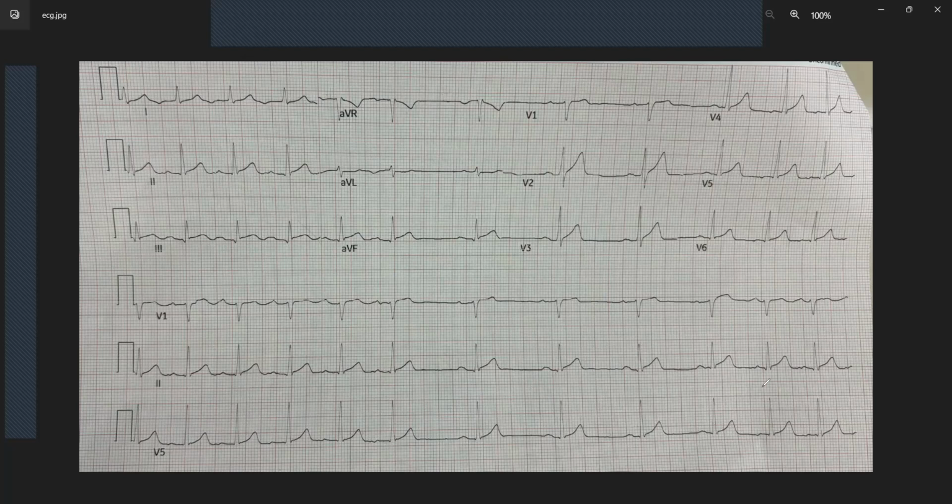So that's one of the things that we can pick up. So this is a rhythm disturbance as well. We've got a Mobitz type 1 that's going on. We've got narrow QRS complexes. Do QRS complexes follow every P? No, because we could have a possible P wave here, although it doesn't pick up so well. And here we could see a possible one where the gap is.